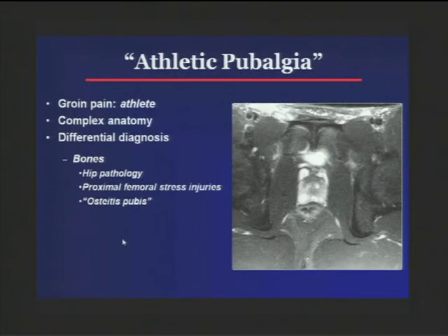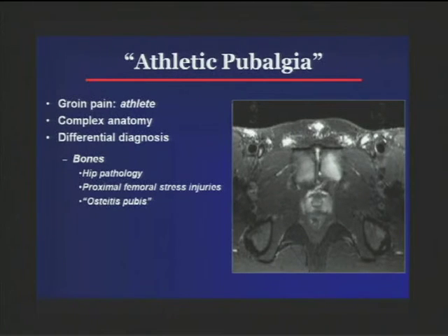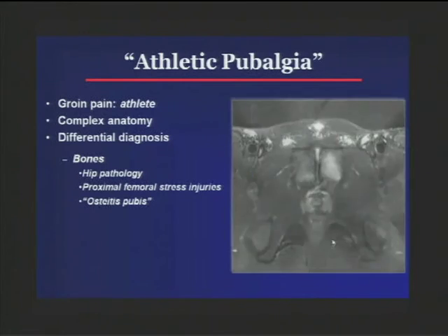And then this, again, kind of like chondromalacia patella, osteitis pubis, kind of a garbage basket term, but we take it to mean stress changes within the marrow of the symphysis. Here you see more unilateral edema on the right in this patient. Here you can see bilateral, a little bit more on the left, and you see fluid within the joint itself. We would probably describe this. Sometimes the residents or fellows will use osteitis pubis. I tend to be more descriptive and just say compatible with stress changes along the symphysis pubis.